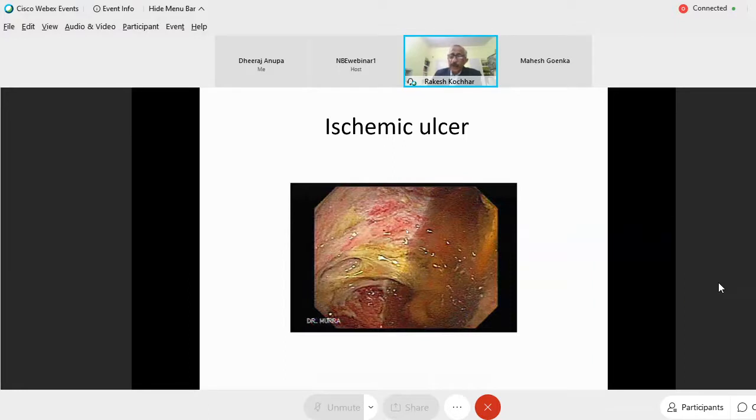Sometimes you have uncommon lesions, ulcers, which have to be read in the context of the basic disease. A patient with hypertension, ischemic heart disease, this was on colonoscopy. So you see the large ulcerated area with patches of hyperemia. Sometimes there is possibility of bleed here. So this large ulcerated area, particularly in the splenic flexure or at the sigmoid, would be classically seen in ischemic colitis.